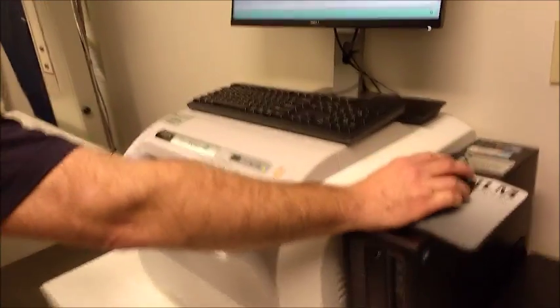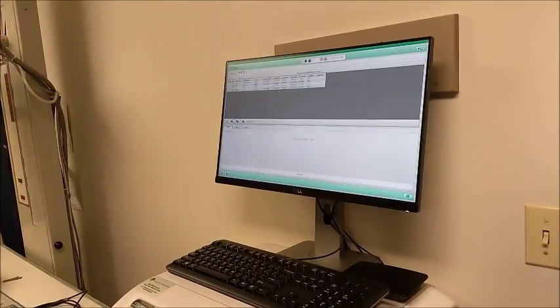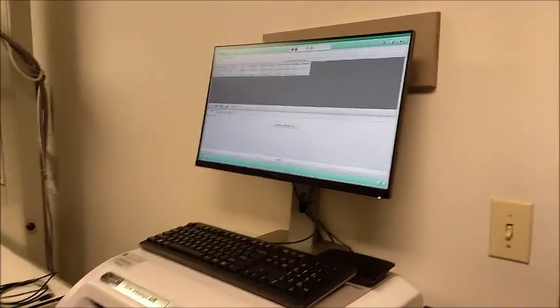And here we are back to our two main screens: new patient, study list. Double click to go to the image viewer.